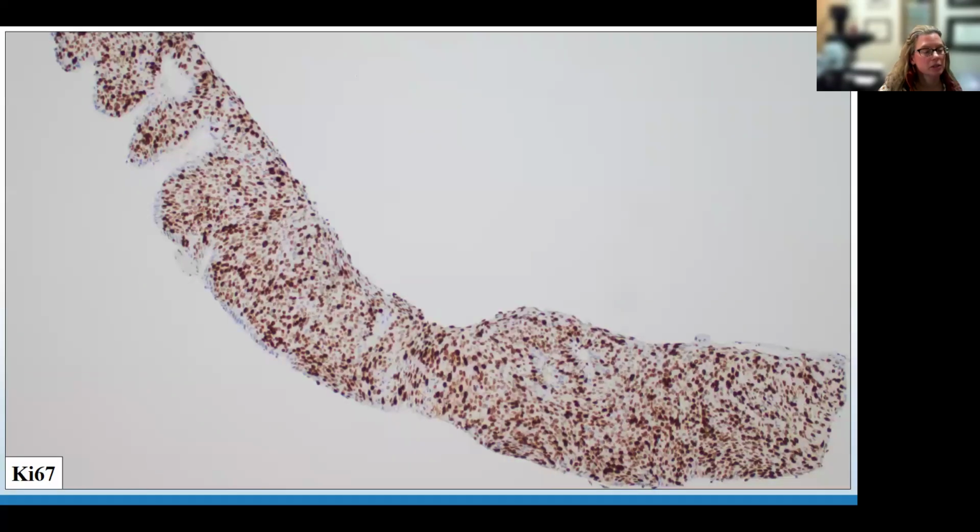And so a Ki67 is a really nice stain to look for proliferation with all the layers of the epithelium. You can also use P53 as a nice companion for Ki67 to look at that full thickness staining, as well as I often use a P40 when I think about invasive squamous cell carcinoma, as well as a P63. And so that's something you can do if you're worried, as well as a PAS stain to look for the basement membrane. But often these are very surface specimens, and they'll treat with chemotherapy after.